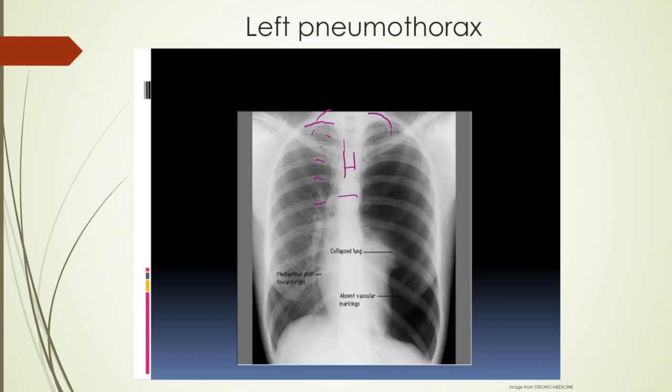C for cardiac silhouette, and you see the cardiac silhouette here. It looks difficult to see on the patient's left-hand side, though you can kind of sort of pick it out there. But when you go on to D for diaphragms, there you go. E for everything else, the left side, good vascular lung markings all the way out, so that's fine. And this is breast tissue, that little line there. You can see the breast on the other side as well.